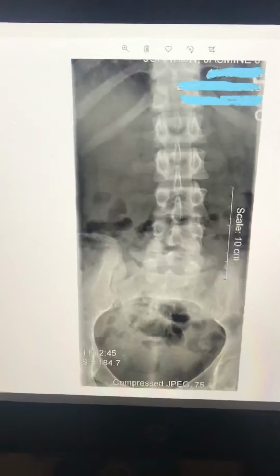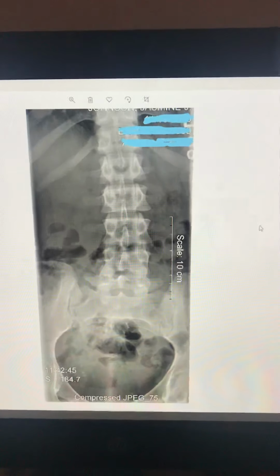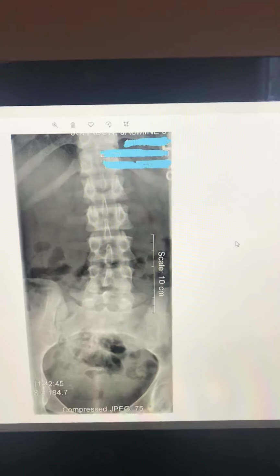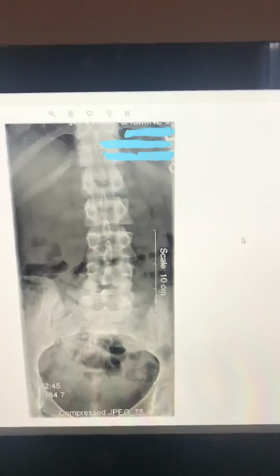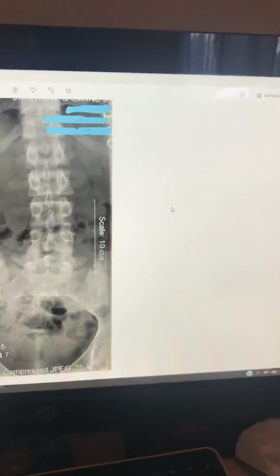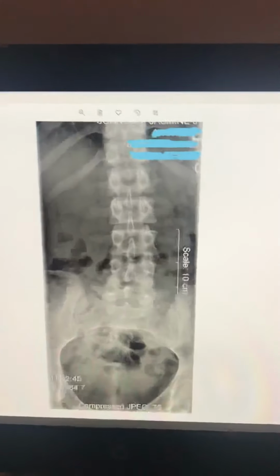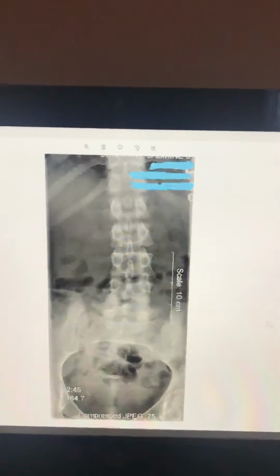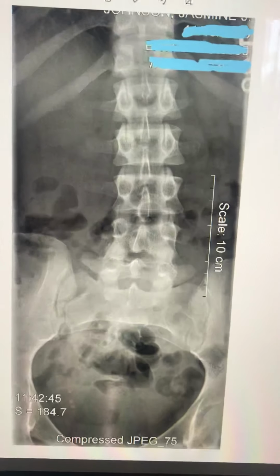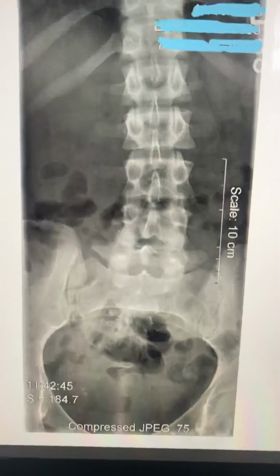Okay, so the image receptor used was a 16x16 digital image receptor. All the images were done at 40 inches SID in the table bucky with the built-in grid. Okay, so first up we have the AP. The technique was 90 kVp at 10 mAs.